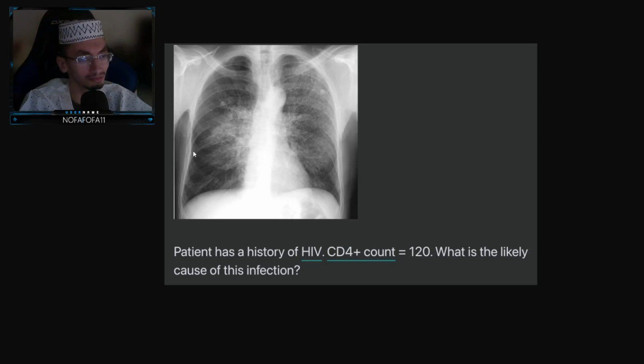When I look at the ribs, on the chest wall, the clavicle, the shoulder, on this side as well as this side, they're relatively normal. When I look at the mediastinum, the middle structure, I can see that it is normal. The contour, the shape of it, is normal. The trachea, the heart, the ascending aorta, everything is normal. And when I look at the hilum, the central structure containing the blood vessels and the lymph nodes, overall it's relatively normal. There's no enlargement.